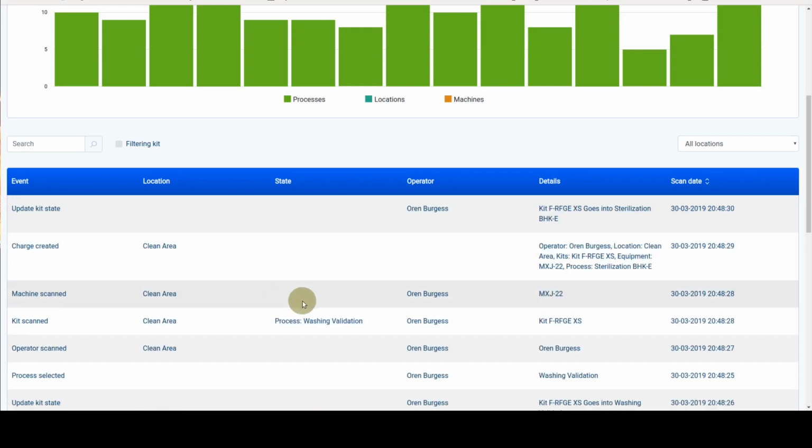or it can be checked later on the reports feature. Another feature is the distributed ledger technology module, which allows you to copy the relevant sterilization data to a decentralized database. Why is this useful? Firstly, it can provide hospitals and sterilization facilities with a way of gaining the trust of the stakeholders by assuring the transparency of the sterilization process. Secondly, if an organization needs to prove that the specific instruments followed a process correctly, it's easy to do this when all relevant sterilization data is available on the distributed ledger.